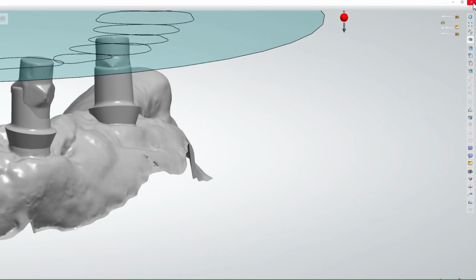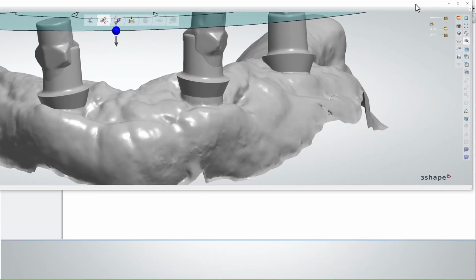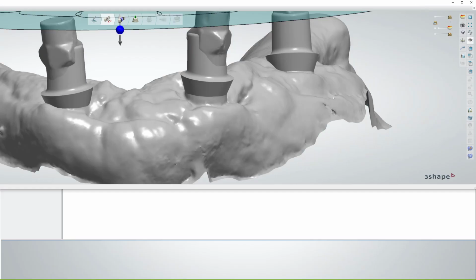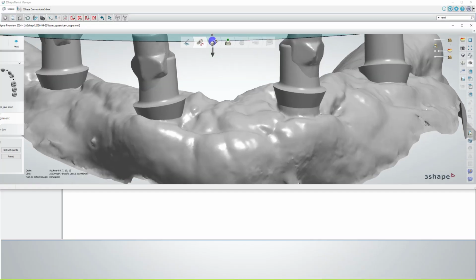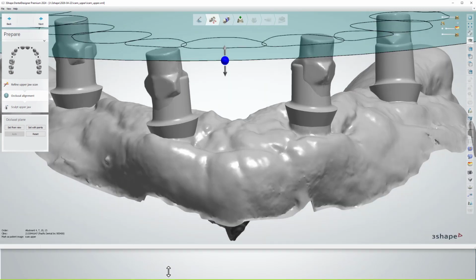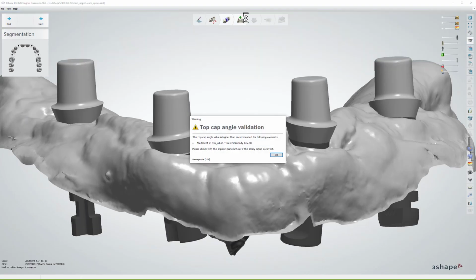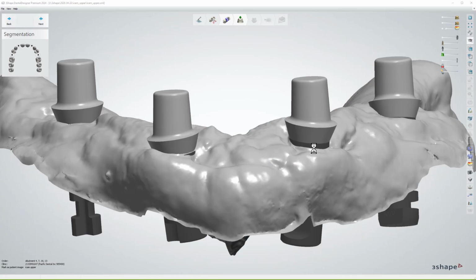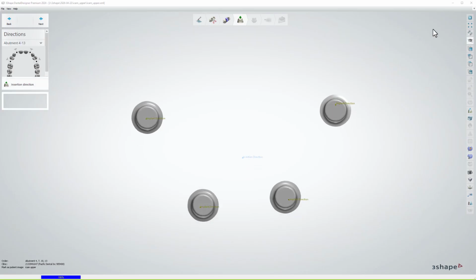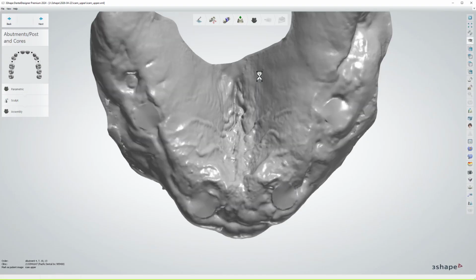This is why I do these tests to see. When you have data, like that scan of the abutments, that's to the scan. The scan's never going to change. It just changed the order. The coordinates are never going to change, right? The library is going to change, and the position upper and lower. I wouldn't just wing it and change it. You guys know what you're doing. You need to do your work.